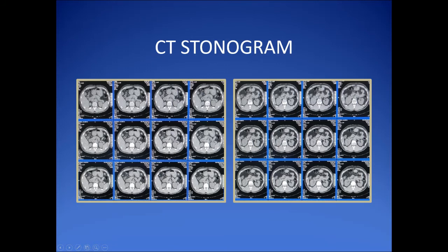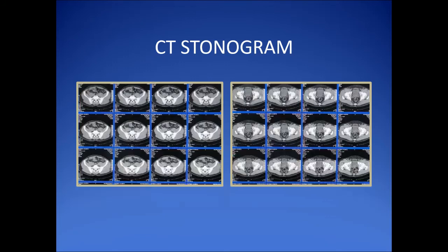Here we don't need any preparation, we don't need any contrast material. Down to the most inferior aspect of the urinary bladder. Any lithiasis appear as hyperdense or white.